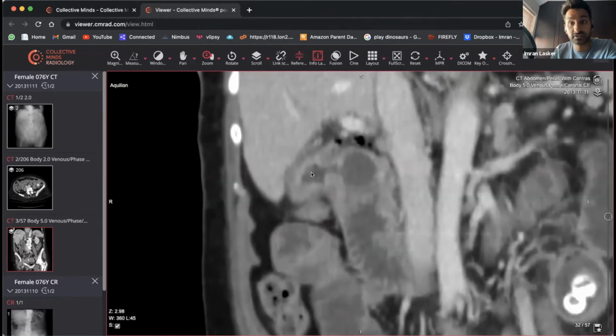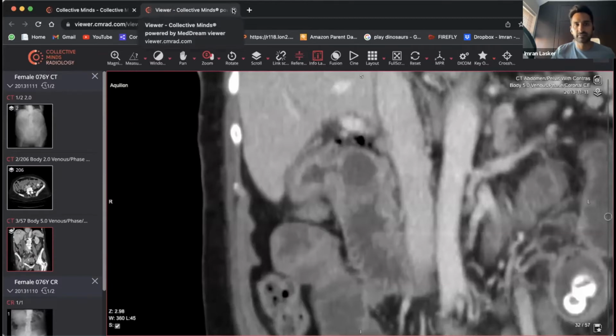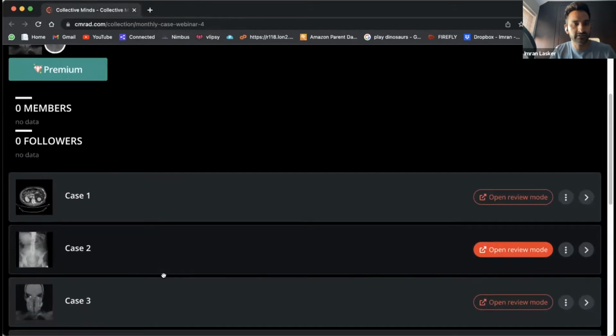So these gallstones have gone on quite a life journey. They've gone from here, this is all they've ever known, the gallbladder, and they decided to go on an adventure, and they've actually ended up causing a lot of trouble for this patient. And this is called gallstone ileus. And you won't really get a better picture of gallstone ileus than that. I mean, that is as textbook as it gets. And sometimes even the textbooks don't have as good an example of not only the plain film, but also the CT to go with it. So I hope that is useful for someone out there.